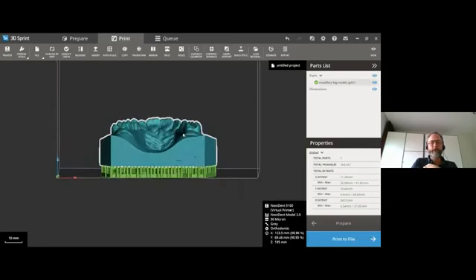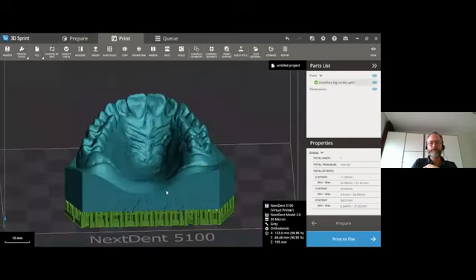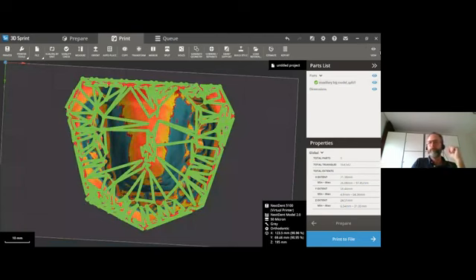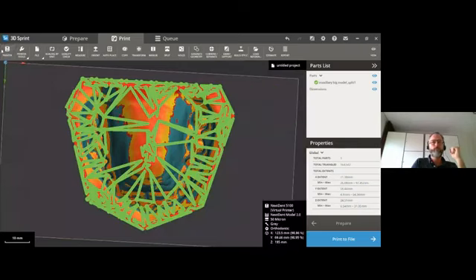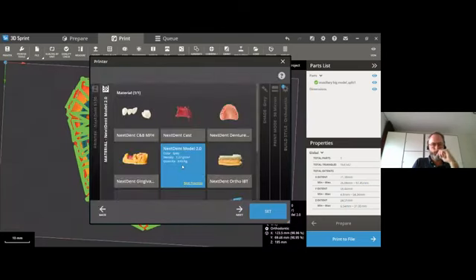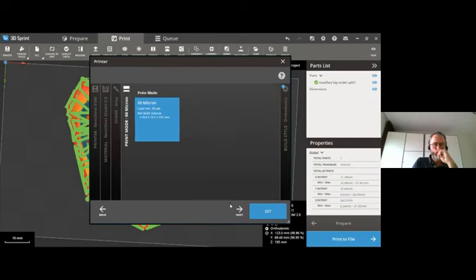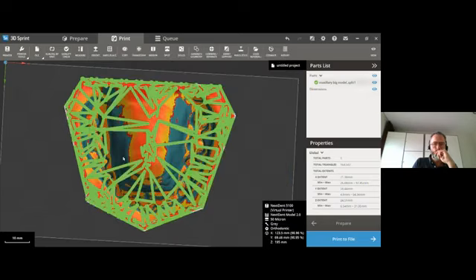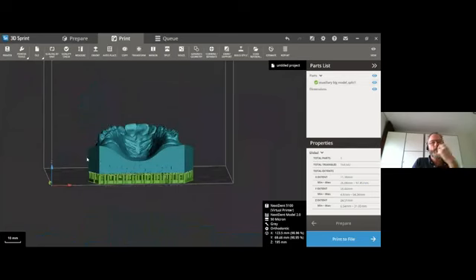That's great. That's awesome. I have currently 2 more questions, and they are related to this topic. One question is, when you go into your printer settings and you select a build style, for example, for models, you can choose between orthodontic, prosthodontic, and premium. But later, when you do the smart support, some very smart people have noticed that you there also can then choose between orthodontic, prosthodontic, and premium in different sizes. Will this override the build style is one of the questions. Of course, it will not, but you can explain that. And what is the difference there?